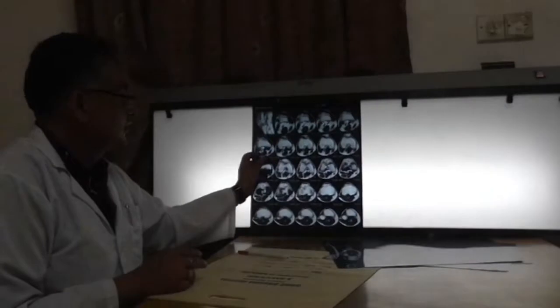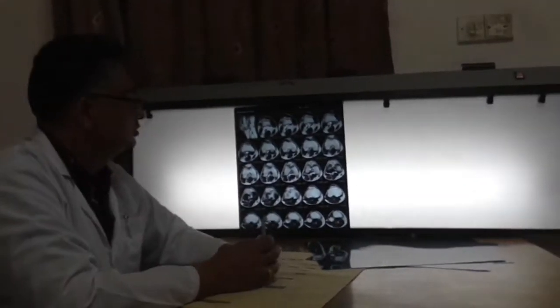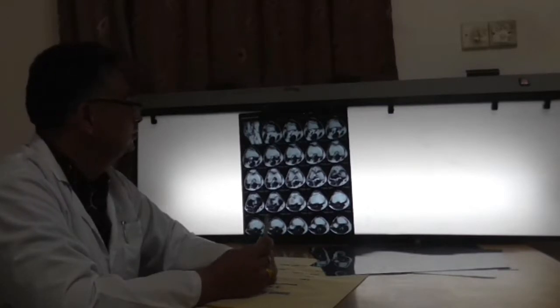So after that, the final section is the axial section. So I put these axial cuts into the view box. In the axial cut, it is very important to see the patella, the patellar cartilage, and the femoral cartilage, and these are very much visible. Also, if the T2 image is available, you can see the fluid.